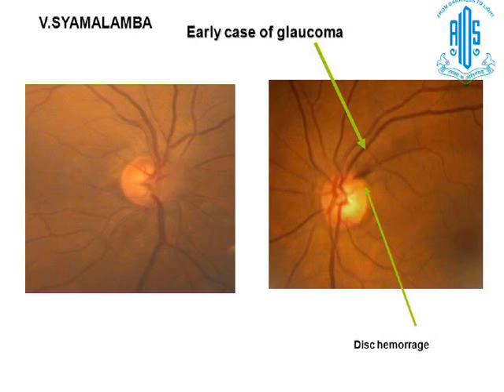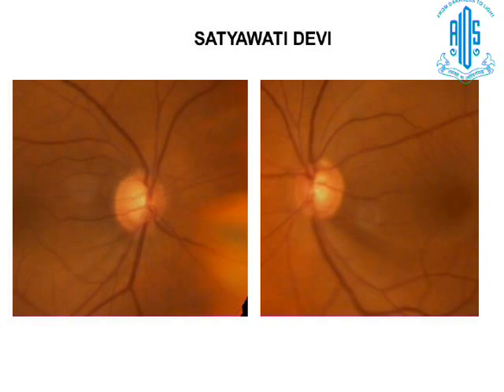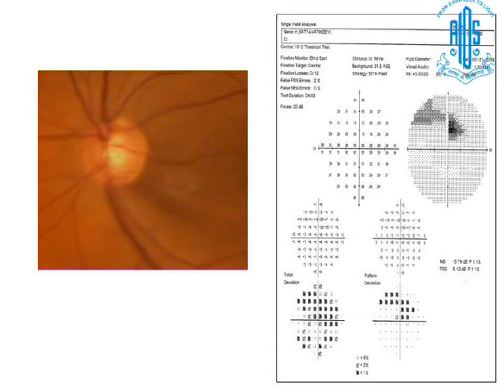So if you see the arcade, in this picture it's not like that. If you see the real one, it is coming like this. It is coming towards the fixation, the 10-2 area. So this case also started in 24-2 and 10-2. In 24-2 it is an upper arcade, in 10-2 it is a lower segment. So in this case also, see, a corresponding isolated field defect is there.